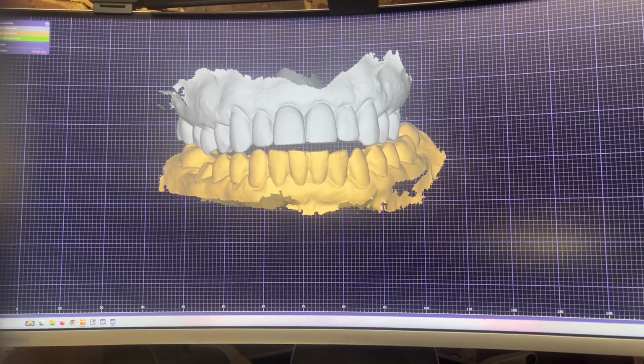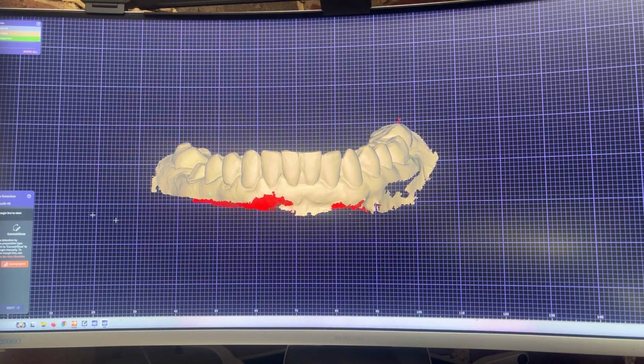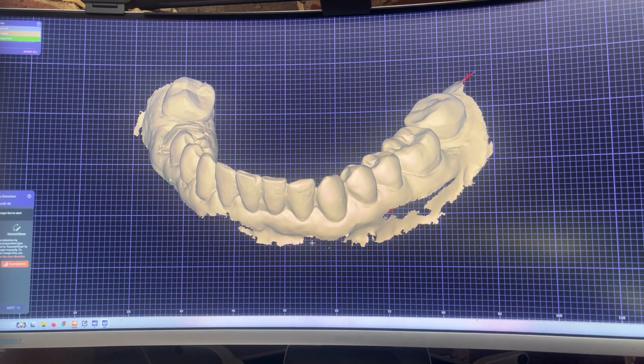So, go through with it. So right now, with this, just like normal working in the lab, you go through steps. Just say 1 to 10. You have to complete the first step before you do the second step, before you do the third step. And they've sort of made that into the program as well. You can go back steps if you need to, adjust something or change something, and then you continue from there.